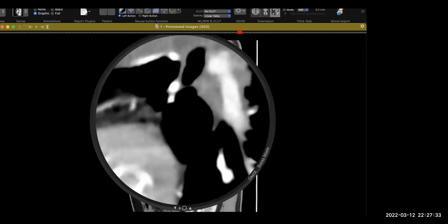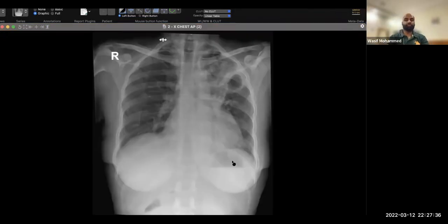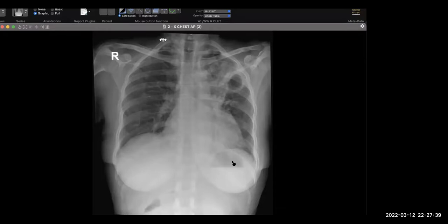So this is your first case. Okay. I have been provided with a frontal radiograph of a skeletally mature patient. I can see there is abnormality predominantly in the left hemithorax involving the lung. There is an area of airspace opacification in the left upper lung field, and I can also see a thick-walled cavity within the area of opacification. There is no significant loss of lung volume. Other than that, I'm looking for any other cavitating lesions. I don't see any other cavitating lesions.